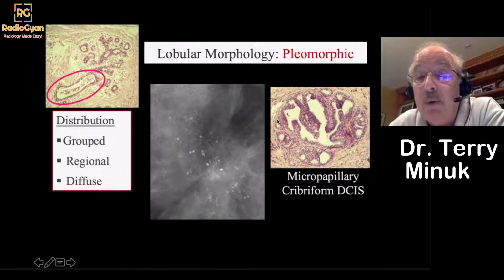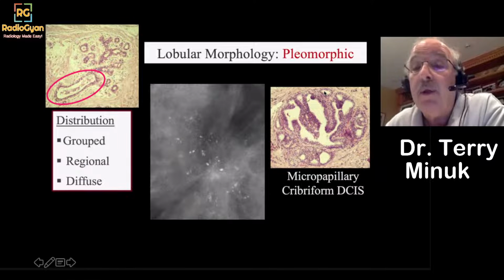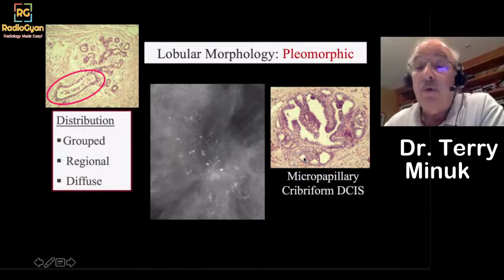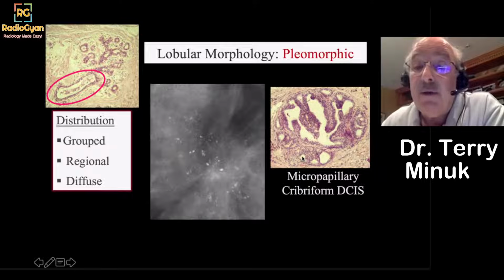It's heaped up tumor cells. They form like canals of Venice, and they leave holes in the wall like Swiss cheese. And where those holes are, you get secretions, and you may get calcification in those holes. And so the calcifications you get here may be different sizes and shapes and densities. They tend to be predominantly calcified secretions.